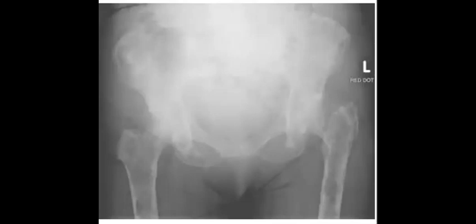Other differentials can be, yeah, brown tumors. If younger, can be fibrous dysplasia, about below 30 years old, so you should be younger. And it can also be Ollier's disease or Maffucci enchondromatosis, but it is not the top of the list.